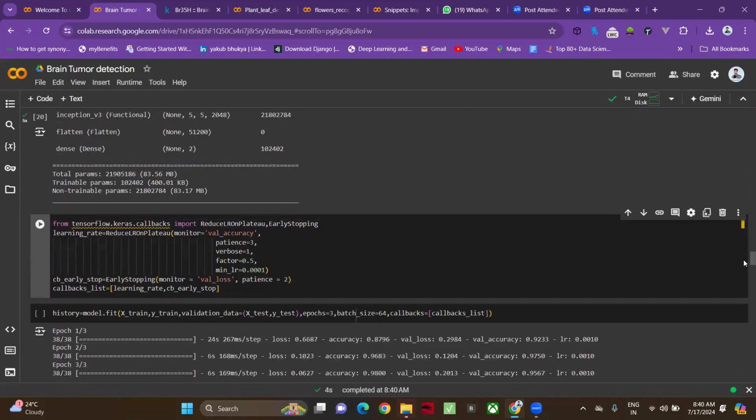Okay. Next, we have to train the model. To train the model, to avoid the overfitting problem, we are taking help of early stopping. The model learns more and more parameters. If it doesn't come to the global minima, at that time I am telling the model to stop. Like that, we specified additional parameters to the model. After specifying the additional parameters, we are training the model.